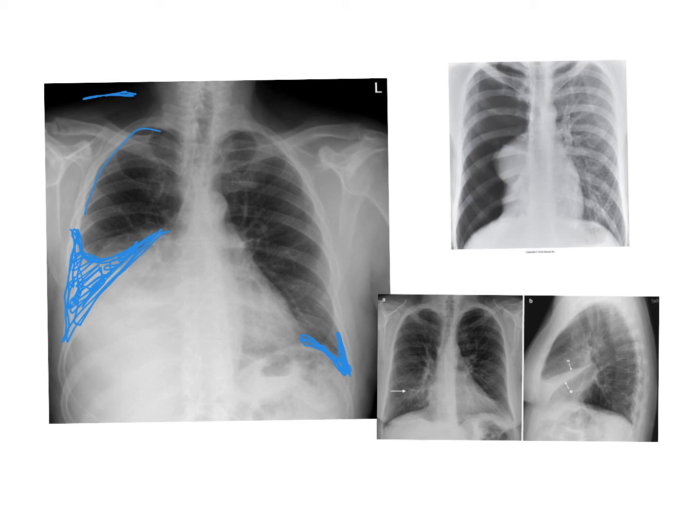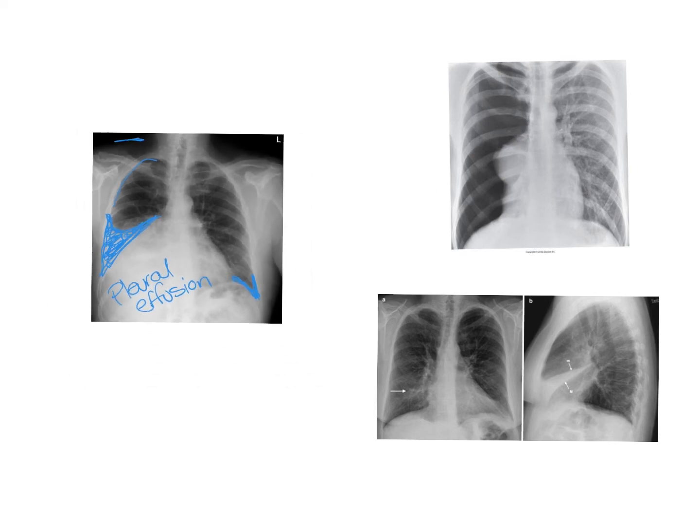That cavity is encapsulating the lungs and should just have that lubricating fluid in it, nothing else, and certainly not this fluid. So this one, again, is going to be pleural effusion. Okay, so let's go on to the next x-ray.